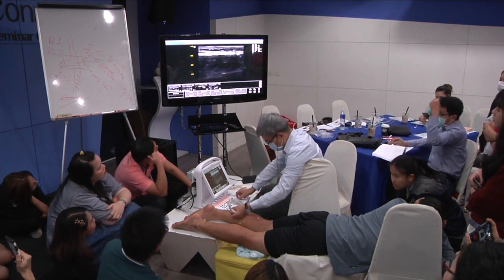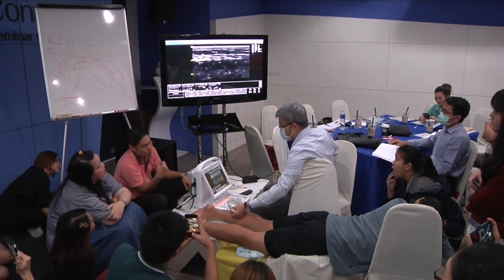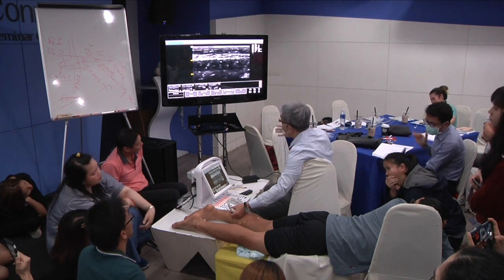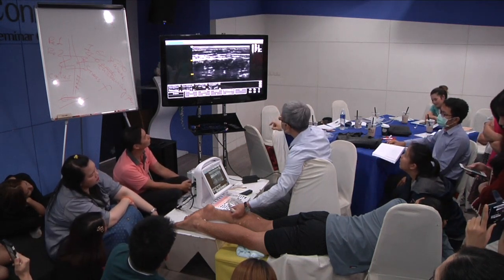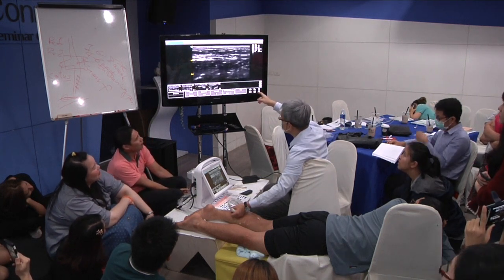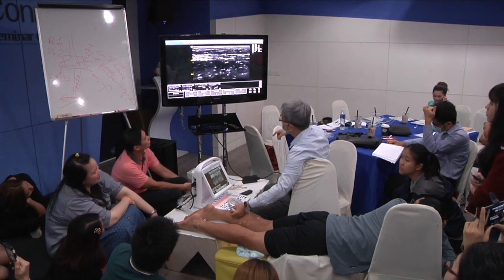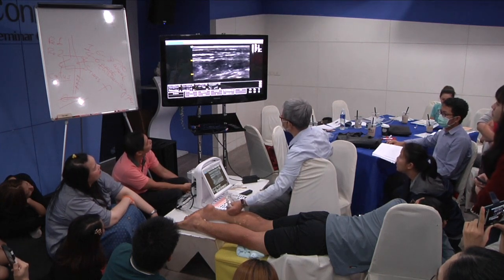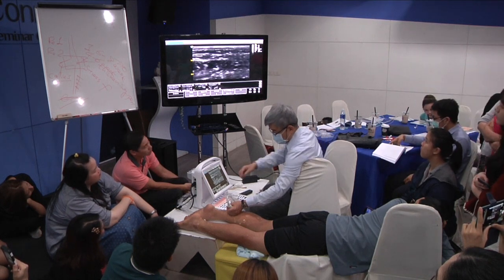And when you look at the beginning of the Achilles tendon, you think, wow, it looks like finger tendons, very thin, very small, right? It looks like tibialis. Sorry, it's my fault. Extensor hallucis longus. Yeah, very thin, but close to the end, wow, it becomes very thick, right?